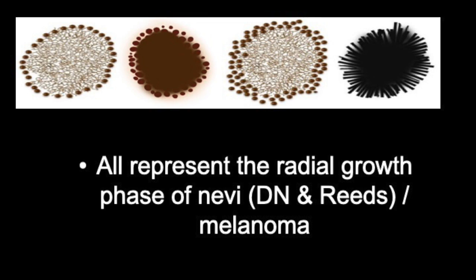And here, everything that Sheila said this morning holds true, right? So if it's somebody less than 12 years old, all 3 of these patterns are considered okay. You can leave them alone, send the patient home. Obviously, caveats of what the parents want to do and so forth. But they're benign lesions. However, if you have somebody over the age of 12, and obviously the older it becomes the more concerning, there is a probability that a melanoma could masquerade itself as one of these.